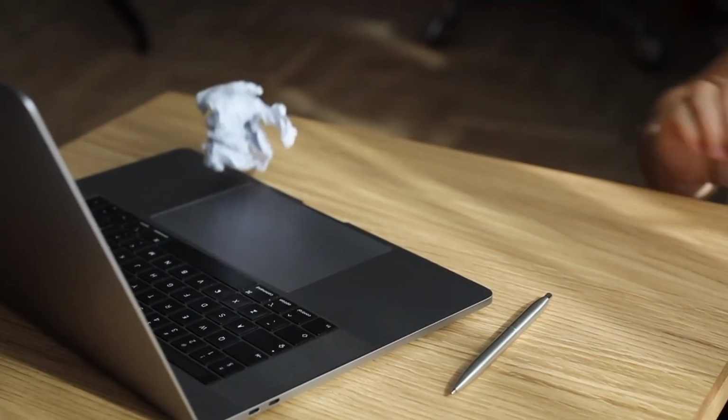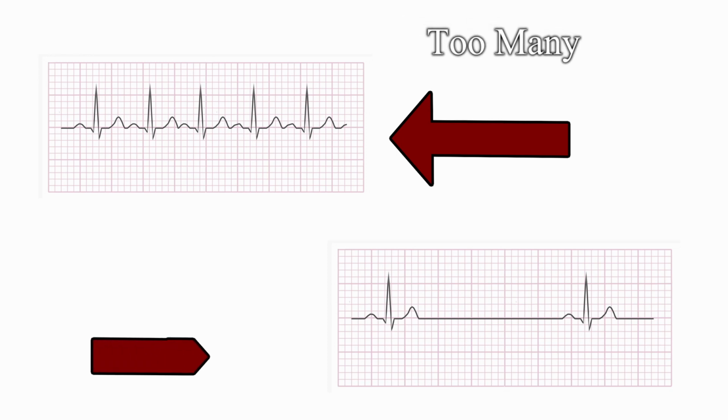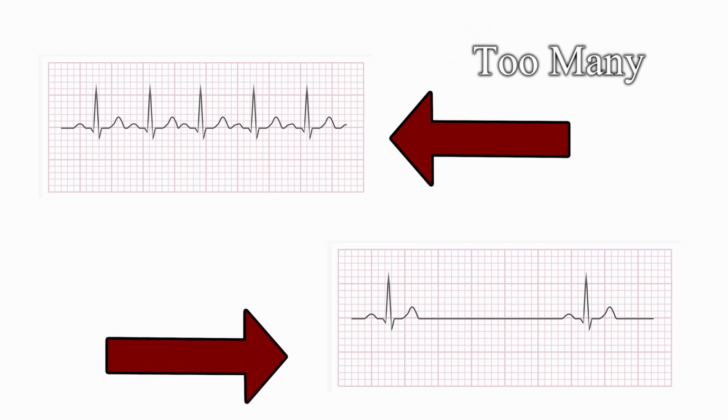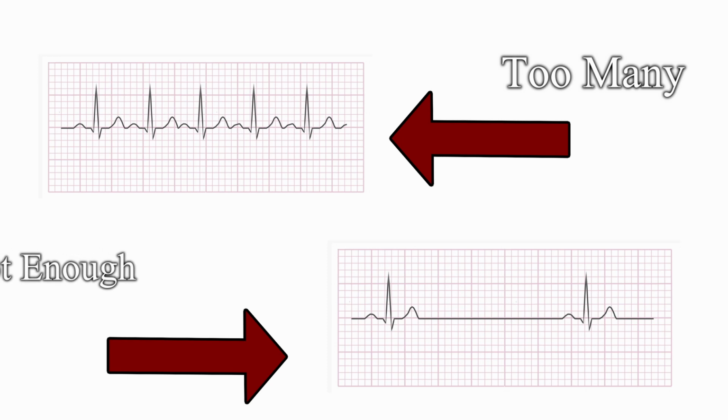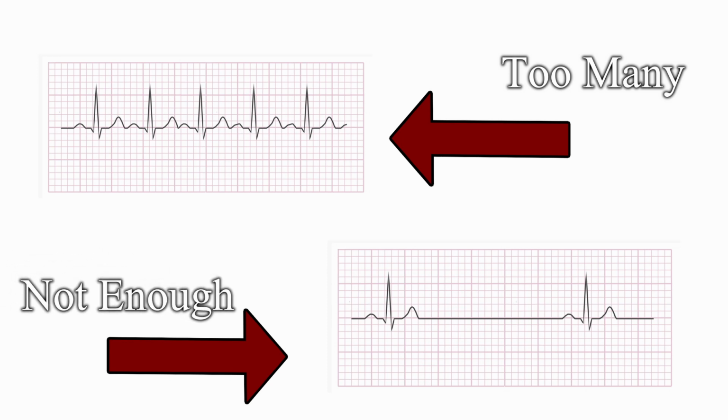One of my starting goals for this project is to get you all to a point where you can look at an EKG and sense what's wrong on a quick glance, and then follow up and figure out what's wrong in detail. This takes a lot of time and a lot of not-so-quick glances, but rate is a great starting point for being able to eyeball quickly, and then go back and take the measurement when you suspect something is wrong, or if you're just not sure.